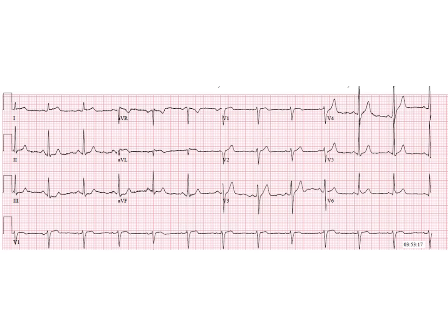You're going to look at the ECG. You're going to find out if it's sinus or not, and you're going to find out if there are any other abnormal findings like ST segment elevation, ST segment depression, Q waves for different types of ischemia, etc. So I don't want you to come into this lecture being like, rate, rhythm, axis. Don't do that. That's not going to help you on USMLE, and it's not going to help you on COMLEX.